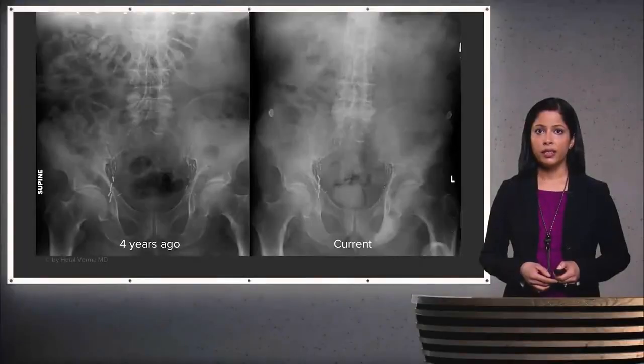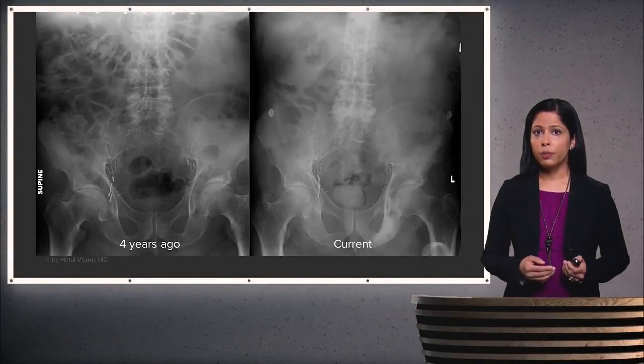So let's take a look at this case. Again, we're focusing on the bony structures here. So can you see the difference between the image that was obtained 4 years ago and the same patient's image that's obtained currently?